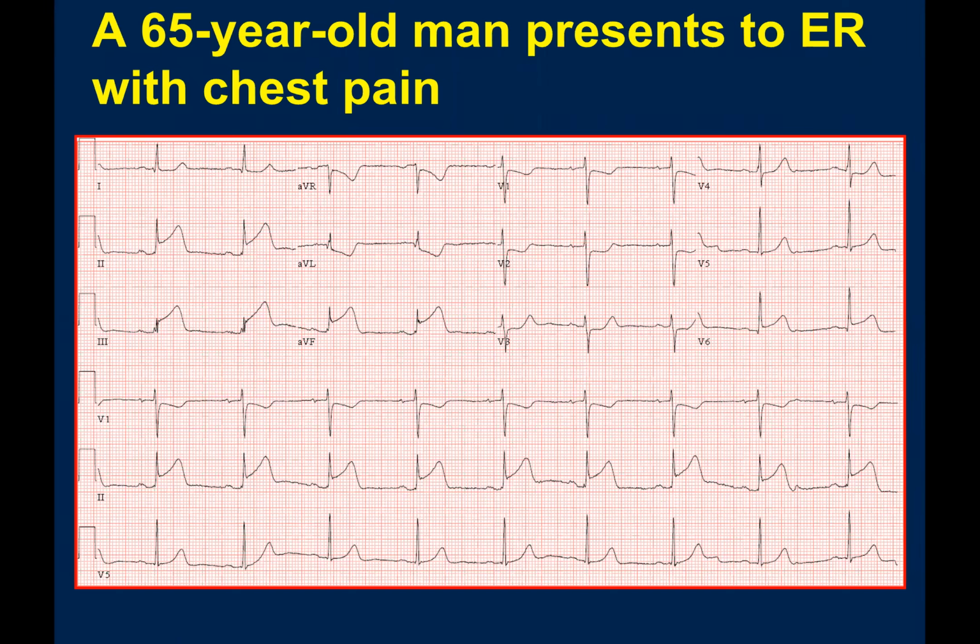So this patient clearly has an acute inferior ST segment elevation myocardial injury. We say injury, not infarction, in this case, just based on ECG reading, because we don't see pathologic Q waves. He did not have Q waves yet. However, management is the same as infarction. You mentioned some changes there, which are reciprocal changes. So what do you think about V1, V2? There is ST segment depression and T-wave inversion. What do you think of these changes in V1, V2?